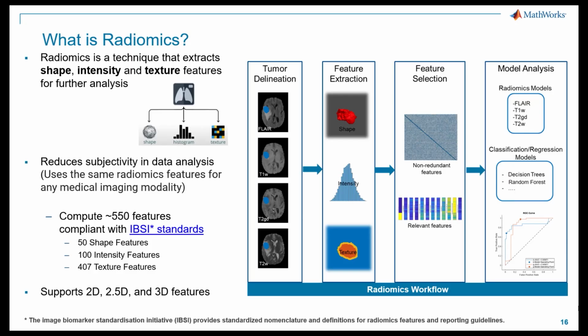Now let's turn our attention to radiomics. I'm going to preface this conversation by saying that we're pretty excited about this topic, and the reason is we've helped many customers over the years to characterize regions segmented in their imagery by selecting some subset of region properties that characterize those regions, and then using those properties to build some kind of predictive model. And every time we do that, the process is somewhat laborious. We have to figure out which properties make sense to use, but more importantly, it's quite frankly somewhat subjective. And every time we do this process, we might select different features.